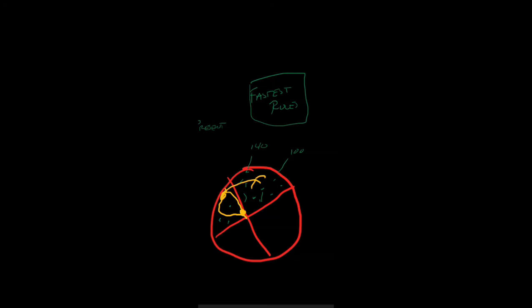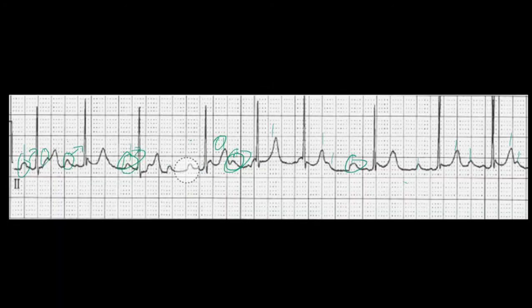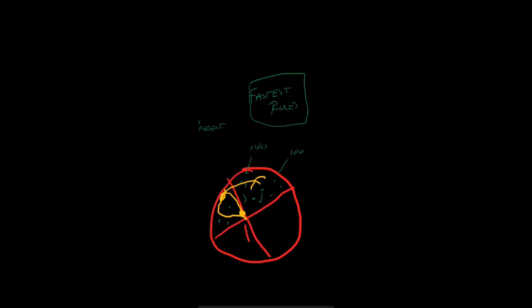So they're all different. Now, why in the world are they not firing off QRS complexes all the time? Well, if we look right here, what we're going to find is that here is a T wave. This P wave fired and there was no reaction right off the bat. The issue here is probably that this P wave fired so close to where this T wave is that it did not have enough stimulus to actually fire off the ventricles.